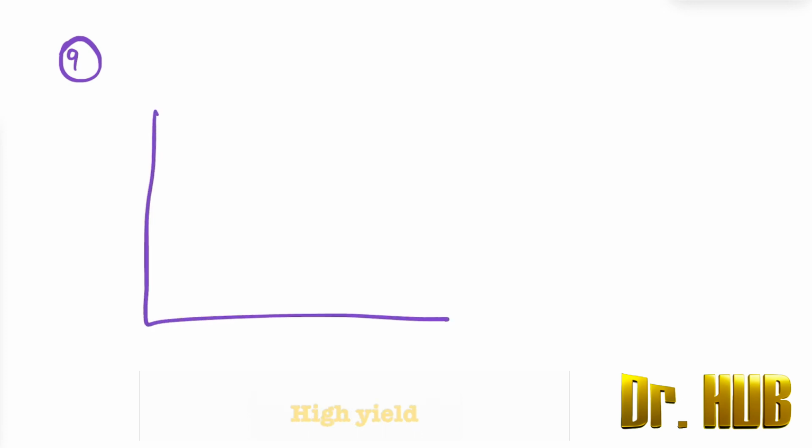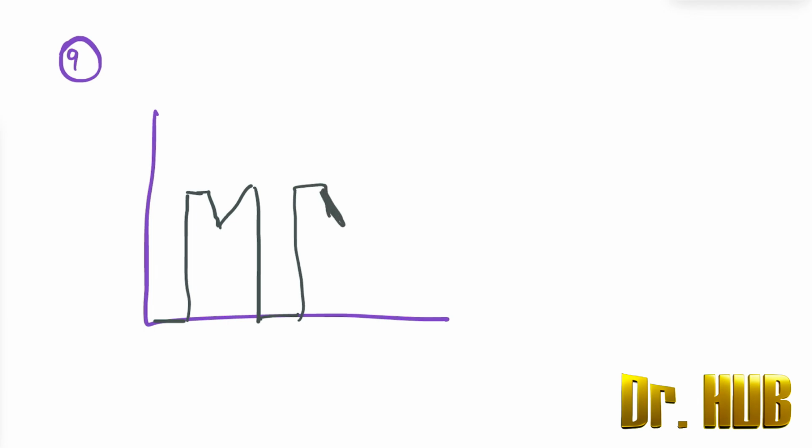Then we move on to number 9, a single lung transplant. It appears as a 90-degree upward rise, and then it comes down. There's a notch, then it gradually increases, and then it comes down. These are repeating units: a notch, an increase, and then it comes down.